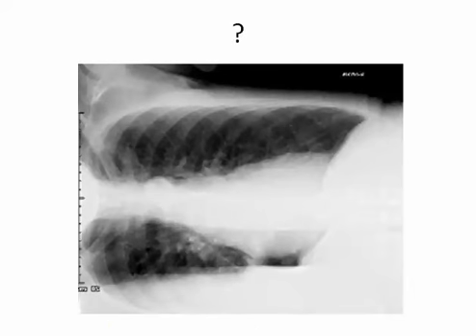This is what we call lateral decubitus. If there is fluid and air, it becomes evident that fluid can seep up, or an air-fluid level can be seen. Thus lateral decubitus is sometimes beneficial if there is a collection behind or below the diaphragm. We call it below the lung, and this is called the subpulmonic effusion.